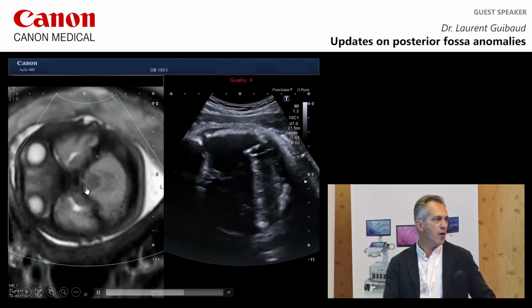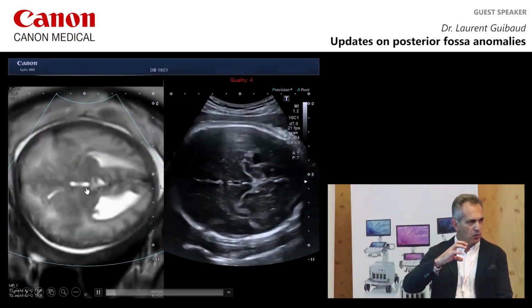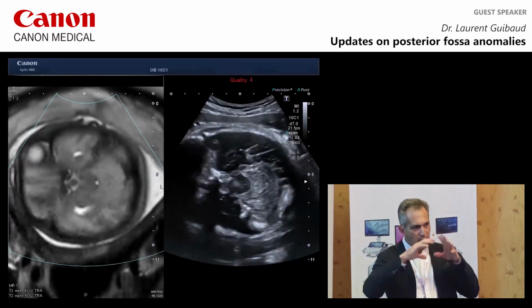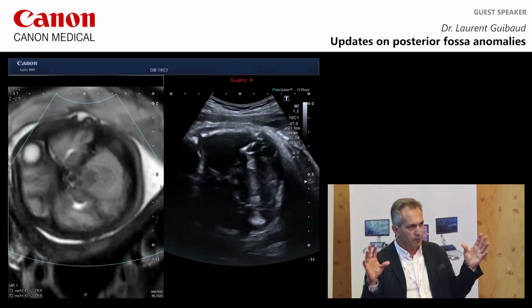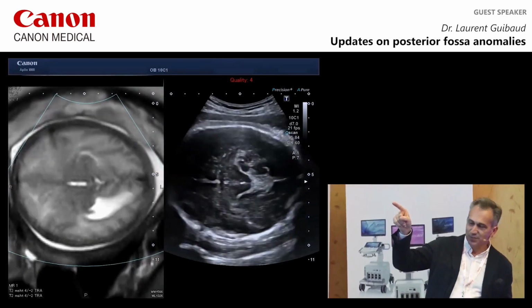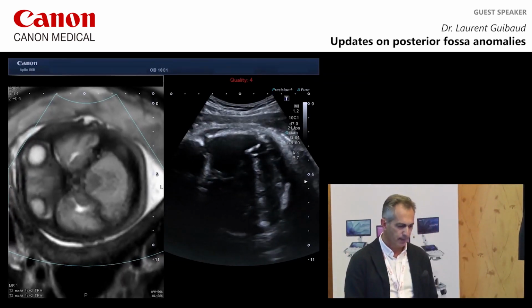It is the suprapineal recess. And you know that the suprapineal recess, which is in connection with the third ventricle, begins to dilate before the dilatation of the ventricular system. So in most of the cases, you have this small cystic structure, which is the suprapineal recess.